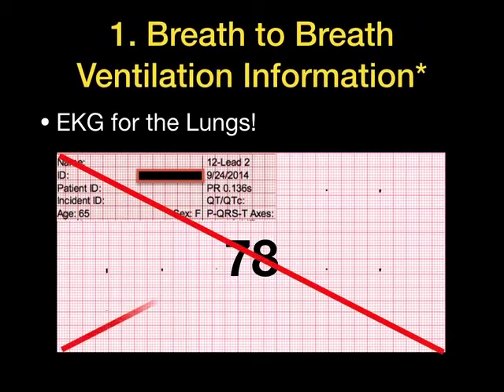And because it's breath-to-breath ventilation, it's real-time information. Think about how powerful that is, and think about how much information that gives us, looking at both the number and the graph. It's like an EKG for the lungs, and you wouldn't want to see an EKG like this, would you?